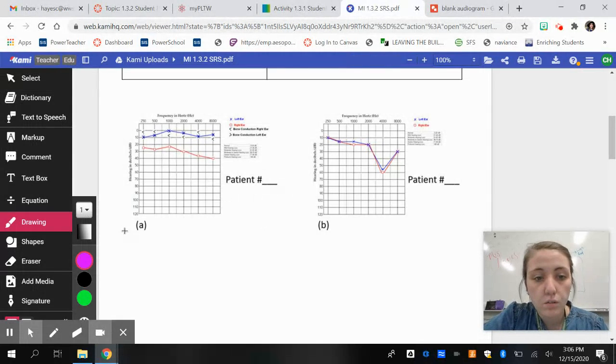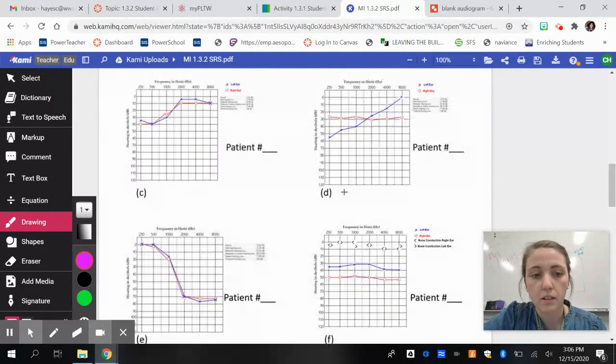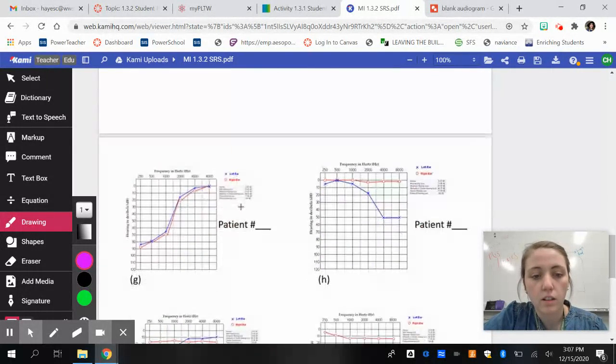So now I'm going to go over here and look at these graphs. Definitely not A or B because there's a big drop in B. Okay, maybe patient C because she, or whoever this patient is, has some lower values and then it goes back up. That's the same general trend. Not this one, not this one, not this one.